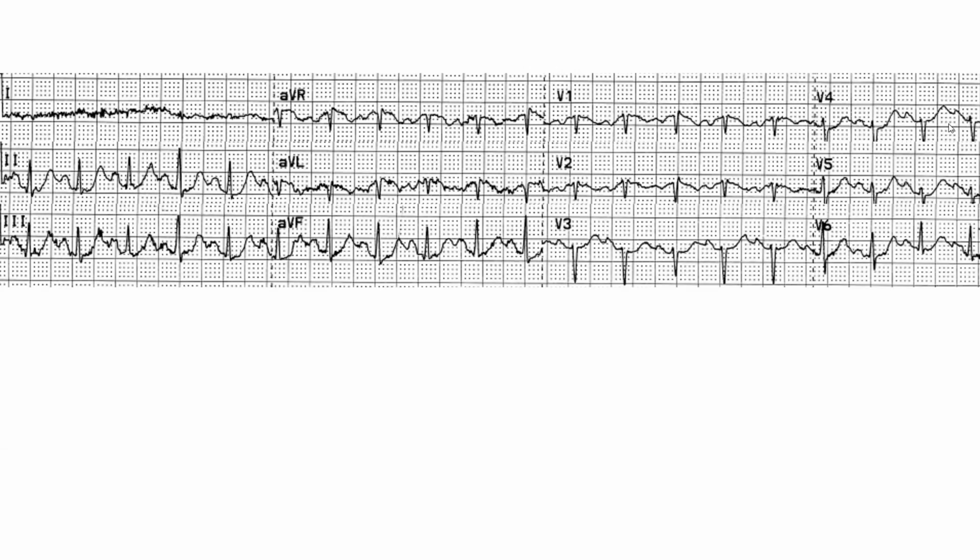This poor R wave progression is suggestive of an infarct, mainly because the R in lead 1 is small and the R in AVL is small, and you possibly have a Q wave in lead 1, and you definitely have a Q wave in AVL. So this is really suggestive of an anterior and lateral infarct. So that's why this poor R wave progression, you don't have any Q anteriorly, but that poor R wave progression in conjunction with what you find in those limb lateral leads is suggestive of a prior anterior infarct.